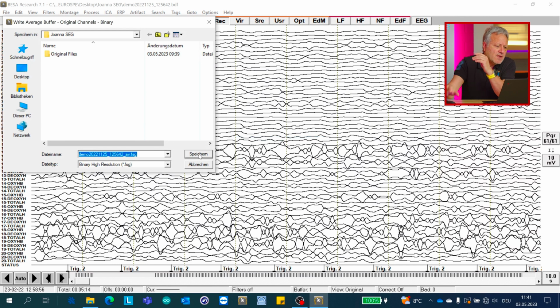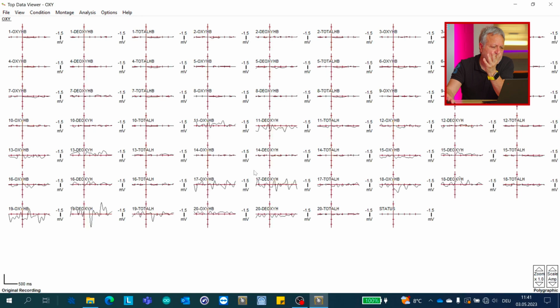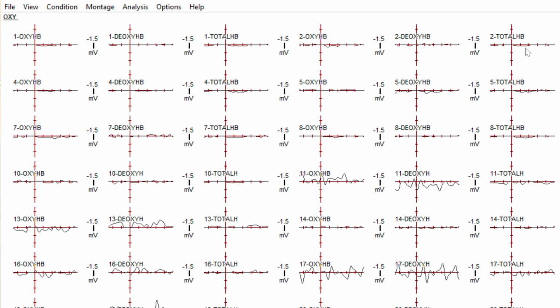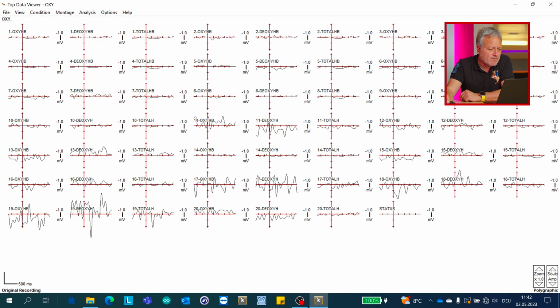And let's see what this could look like if you implemented an actual trigger and were actually anticipating getting oximetry data for this trigger. And so we say save, and this is what it looks like. And that's pretty nice, because now it tells me we have done an oximetry average. We have channel 1, 1, 1, 2, 2, 2. Remember again, it's oxyhemoglobin, deoxyhemoglobin, and total hemoglobin. All nicely presented on a screen, which we can do some analysis.